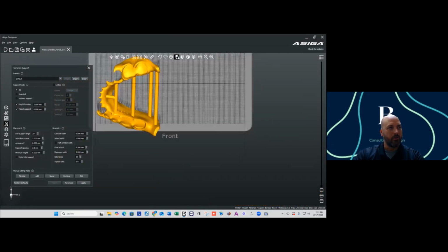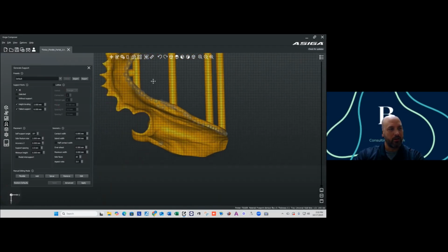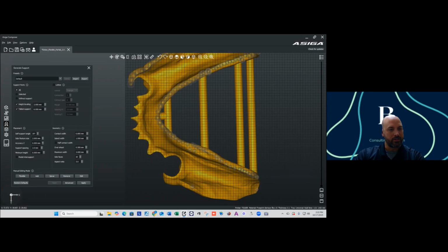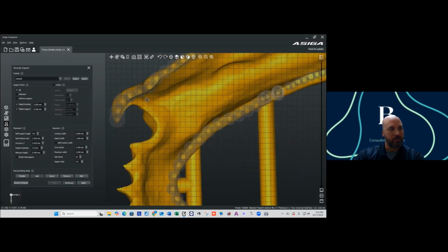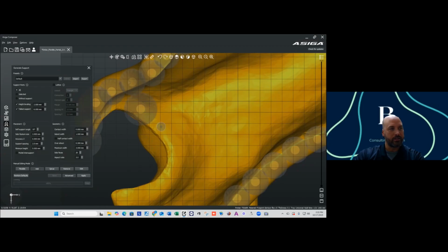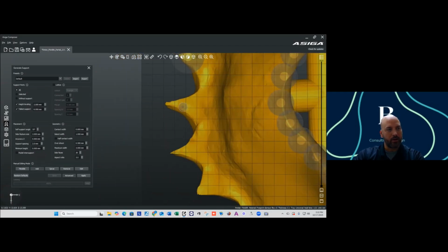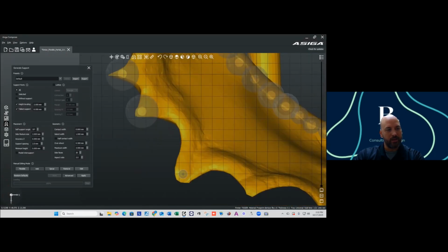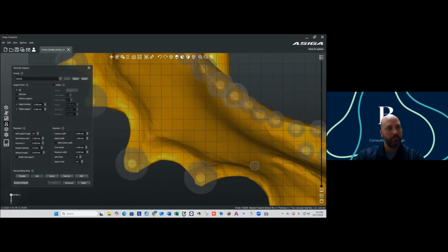So you can see now I've got my supports all the way around the border here, except for down on this side. So now the question is, where do I place the supports here? This is how I do it. I like to go in here along these festooned areas. I try to place a support on each of the areas that go into the interproximals, just because sometimes these areas like to fail a little bit.